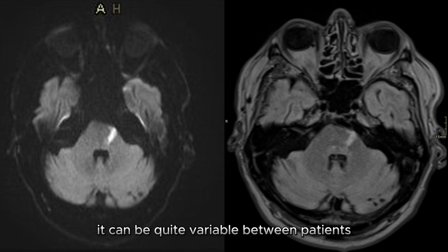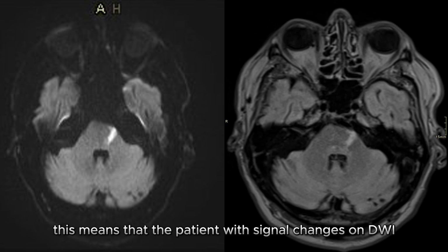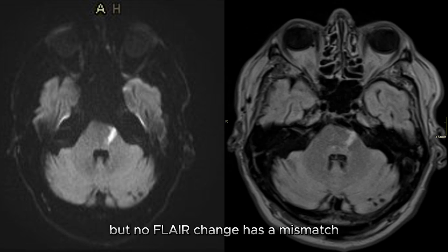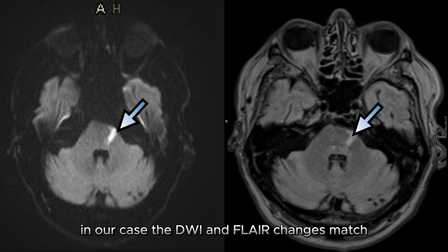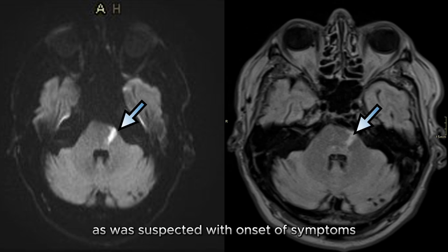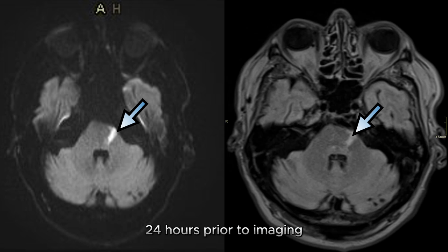It can be quite variable between patients when changes are seen on FLAIR in acute ischemic stroke. However, almost every stroke patient will have FLAIR changes after 6 hours from onset. This means that a patient with signal changes on DWI but no FLAIR change has a mismatch, and we can therefore assume the onset of symptoms within the last 6 hours. In our case, the DWI and FLAIR changes match, as was expected with onset of symptoms 24 hours prior to imaging.